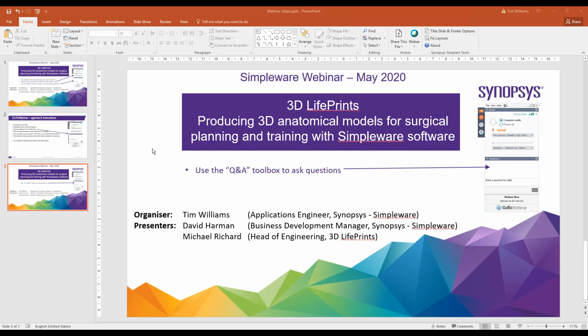Yes, so I think the way to think about the tool is an optimized workflow for segmenting. There's a bit of manual work that goes into it, and then you can use some automatic interpolation of that information to create the full segmentation. So it's very much an integrated segmentation tool. For completely automated tools, we have new offerings such as the AS Ortho product, which are one-click options, but that's a very different tool in itself.